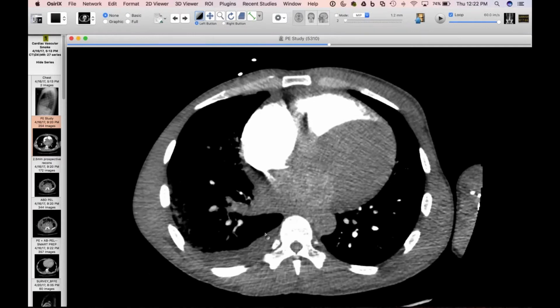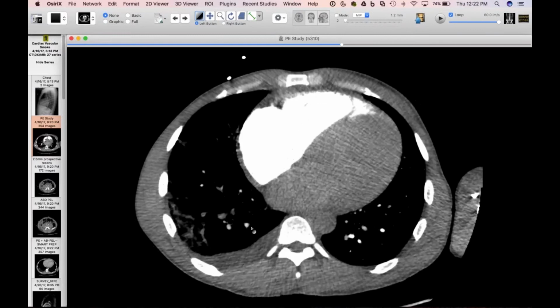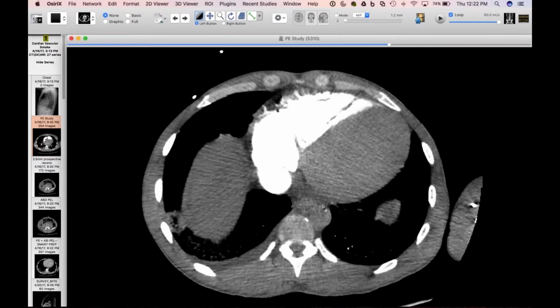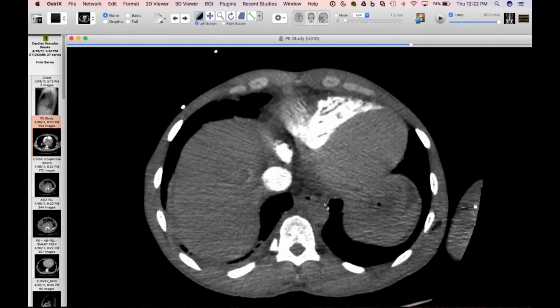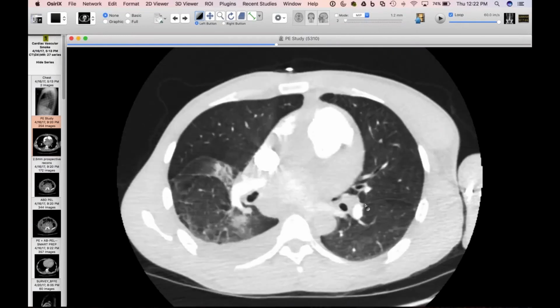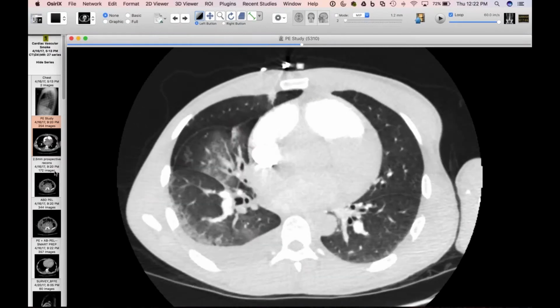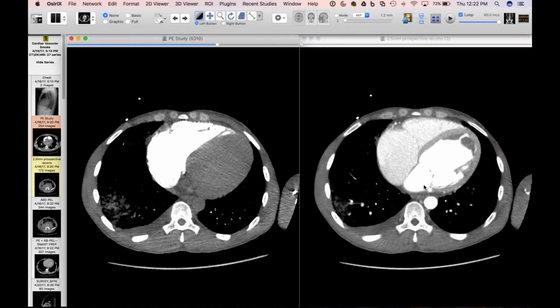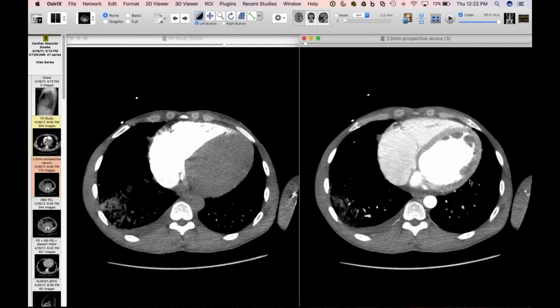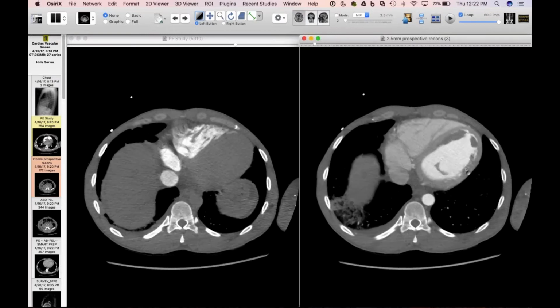And there's a little bit of smoke in incomplete filling in the lower lobes, which isn't the impressive thing, because you see here that there's really very little way to evaluate the left heart at all. And this guy obviously has a dilated cardiomyopathy. He has HIV, he's well controlled, but came in with recent onset dyspnea. And fortunately, they got an abdomen and pelvis CT at the same time, or shortly thereafter. So they scanned the PE, and then they scanned the abdomen and pelvis, because this guy has the most LV thrombus I think I've ever seen here.